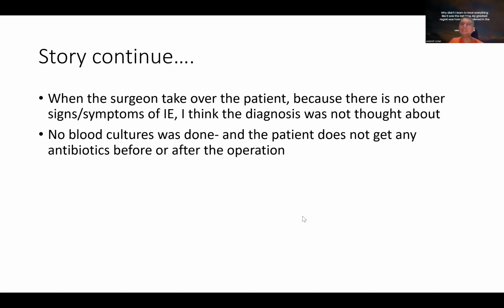And this confusion is very understandable because the patient did not present like an infective endocarditis patient. Okay, the transthoracic echo, because it's not so clear, we can't really determine any vegetation there. And the only way we see vegetation is from the transesophageal echocardiogram.